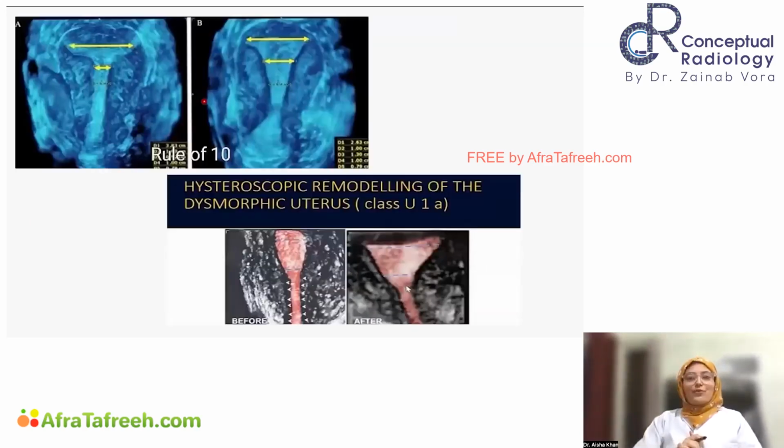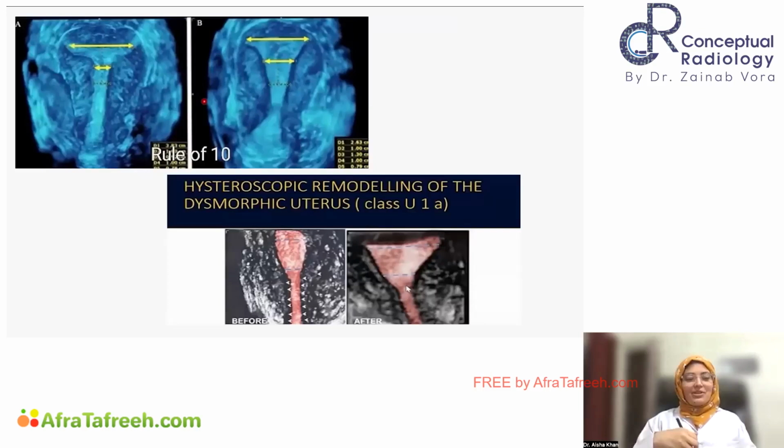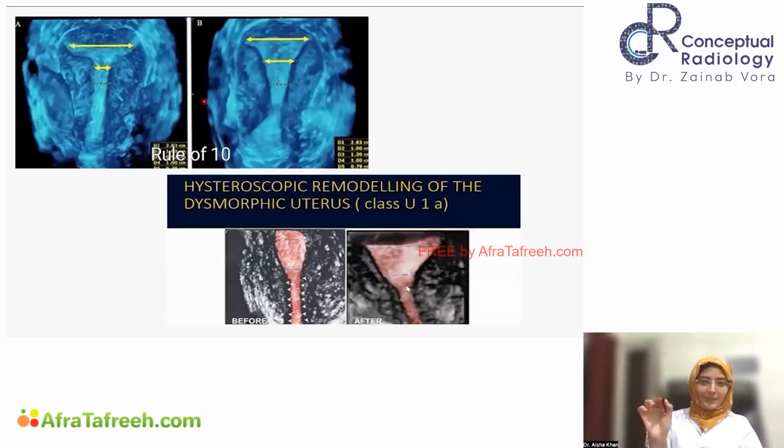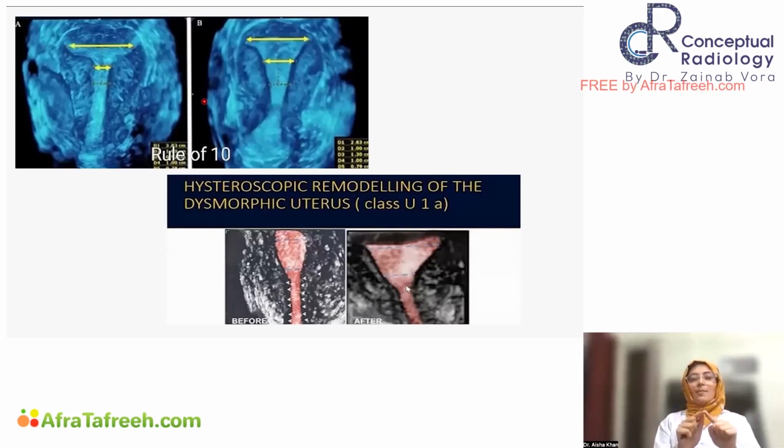Now, we all love shortcuts. Like in physics, we just wanted shortcut formulas so that we don't have to go through that pain of understanding. So here also I have searched for one shortcut for us. That is called the rule of 10, which is for T-shape. So in T-shaped the rule of 10 applies. In this also, first you draw the same thing, the interostial line. 10 millimeters below it, you will measure the thickness of the endometrium. If it is 10 mm or less than 10 mm, that means it is a T-shaped uterus because you have a narrow endometrium.